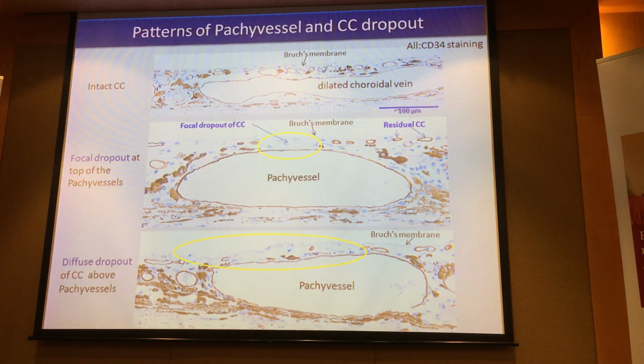And this slide shows the patterns of the pachyvessels and the choriocapillaries dropout. In this pathology, you can see a focal dropout at the top of the pachyvessels here, and there's a diffuse dropout of choriocapillaries above the pachyvessels.